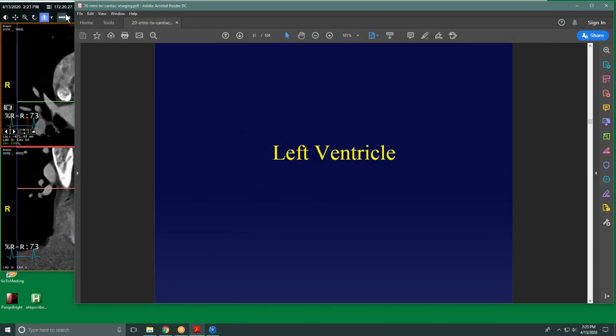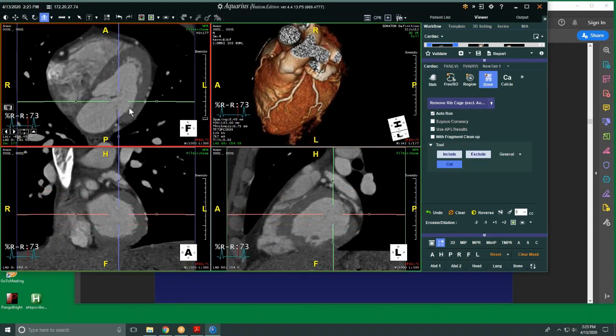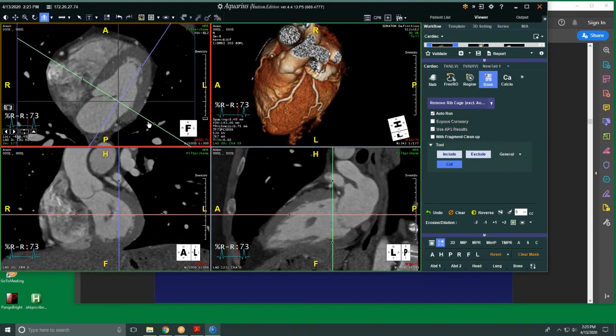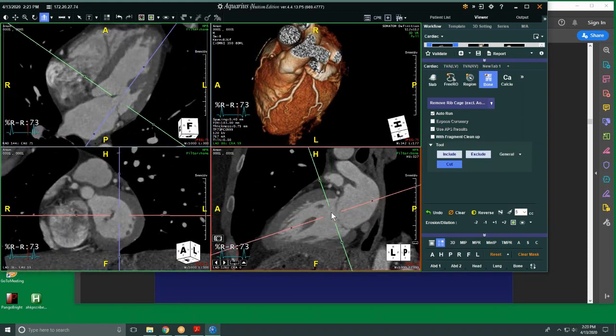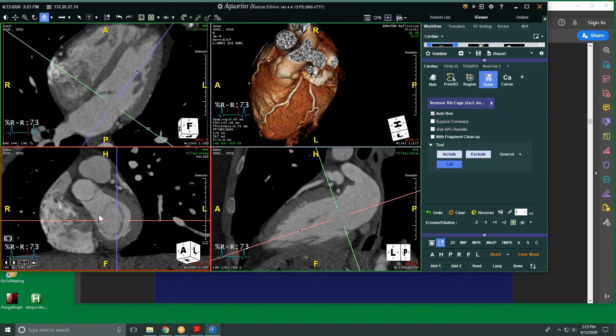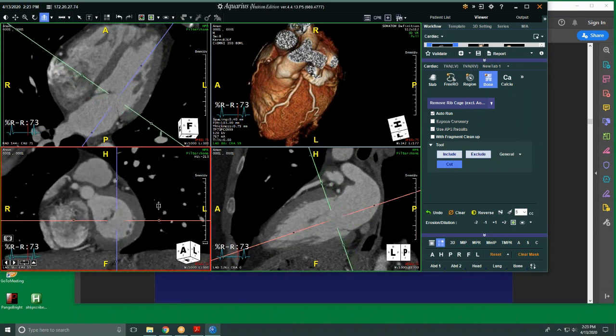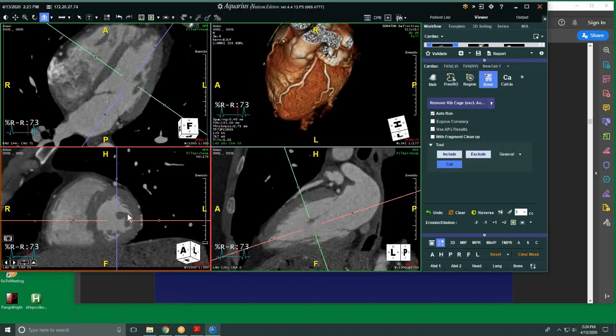Left ventricle. So there's your left atrium, there's your mitral valve there. And you can't see the tricuspid valve very well due to the artifact, but the mitral you can often see a little bit better. Let me just see if we can zoom in there. See there, right? You can actually see the valve apparatus a little bit. You've got the 2 leaflets of the mitral valve, okay, which are supported by, scrolling towards the apex, those guys right there, okay?